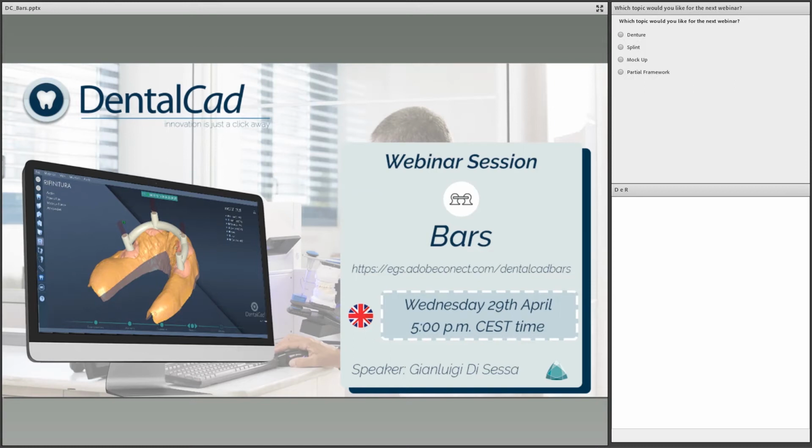Good afternoon. I am Gianluigi Di Sessa from Service Engineering Department. Today I'll show you a bar workflow. If you have any question at the end of the presentation, I will answer them.